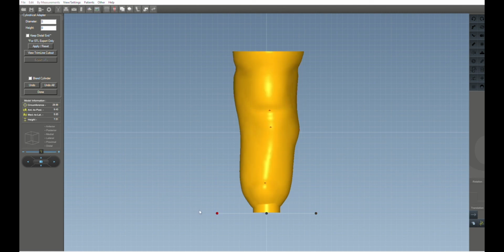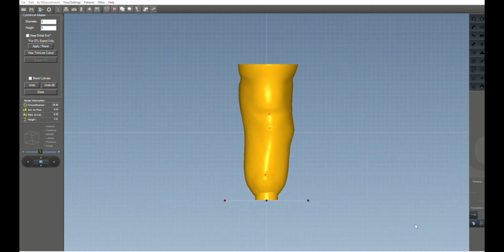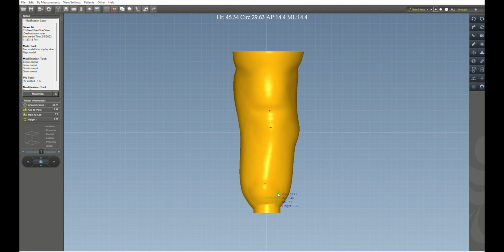I'm going to say that that's looking, maybe I'll move it a little bit lateral. Just a little bit, not too much. Otherwise the pin will have trouble engaging. Right there, perfect. Okay, at that point I can just apply a little blending to this edge.